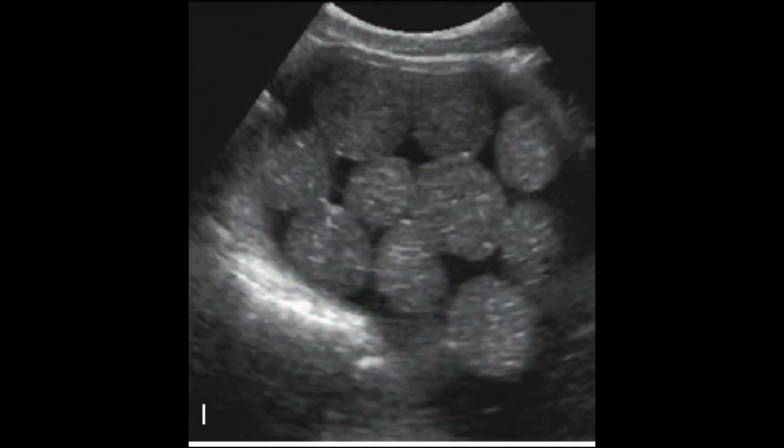This is another characteristic of dermoid. Although this is not very common, it can still be seen, and a dermoid lesion, cystic teratoma, may appear in that fashion. So these slides were particularly showing characteristics of cystic teratoma, and you may come across these types of radiological appearances.